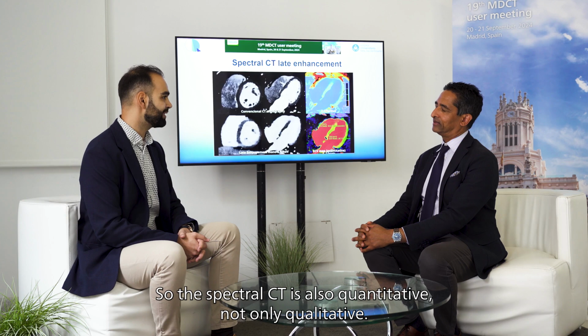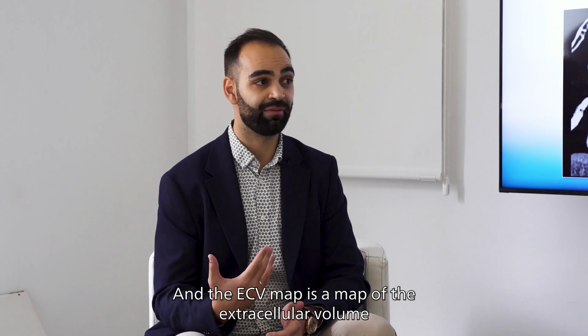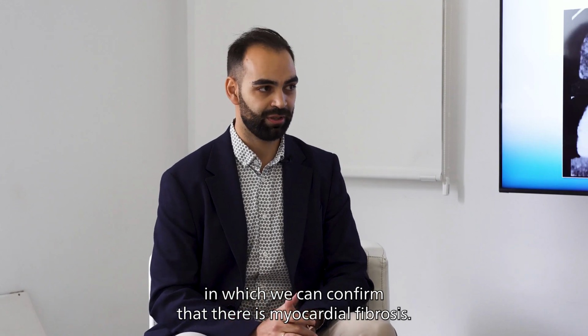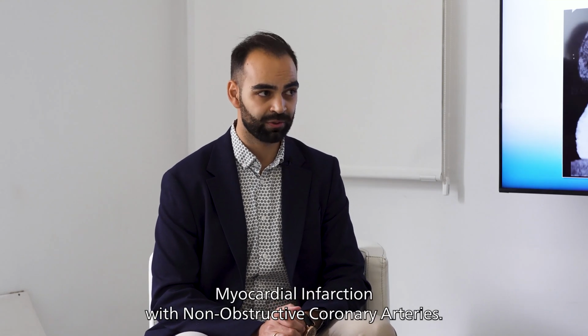So the spectral CT is also quantitative, not only qualitative. An ECV map is a map of the extracellular volume in which we can confirm that there is a myocardial fibrosis.